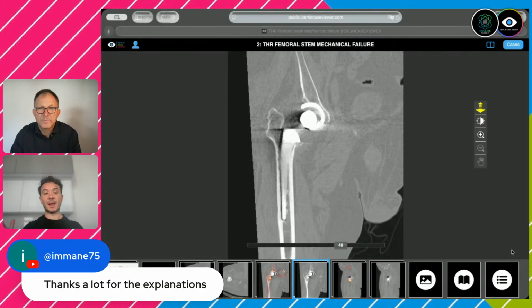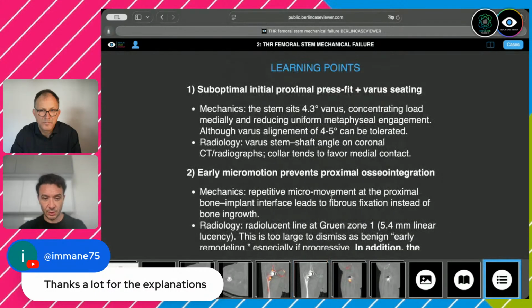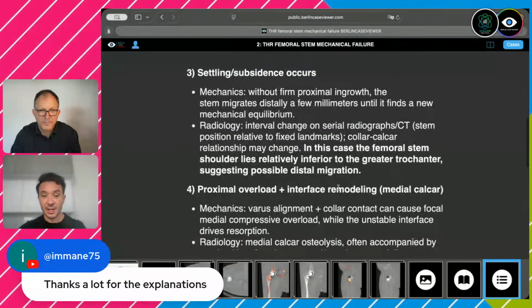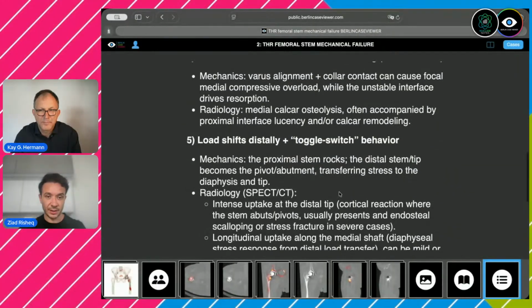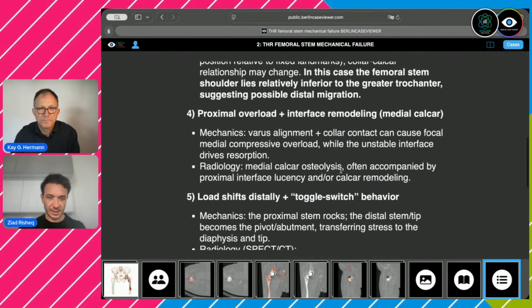So you have to expand the window of the CT in order to reduce this metal artifacts. If you have a metal artifact reduction, that is great. It really helps. But if you don't, like I do, I don't have a metal artifact reduction. So you have to do with what you get. So not to expand this case for a very long period of time.